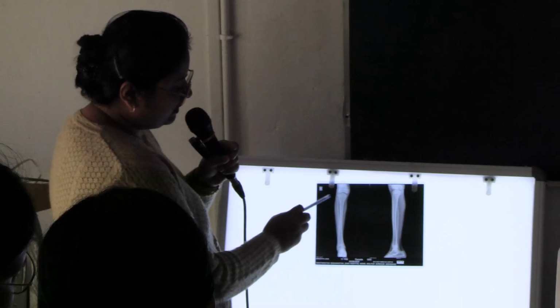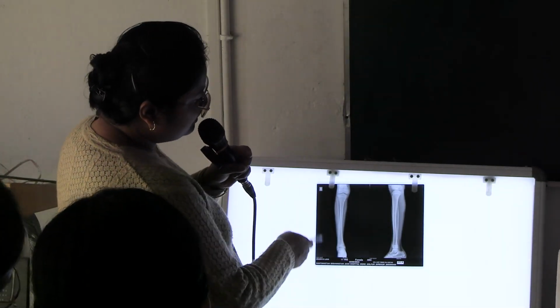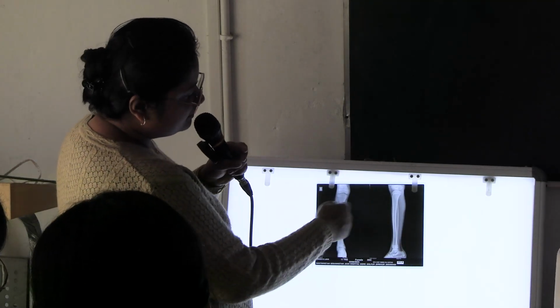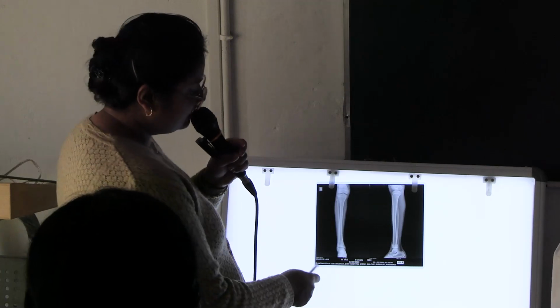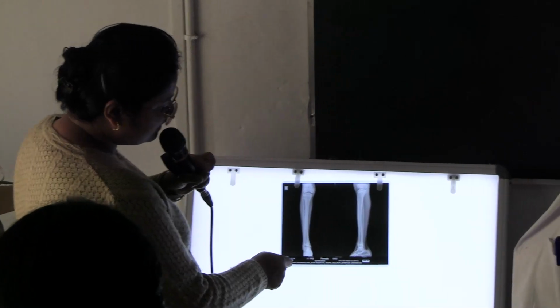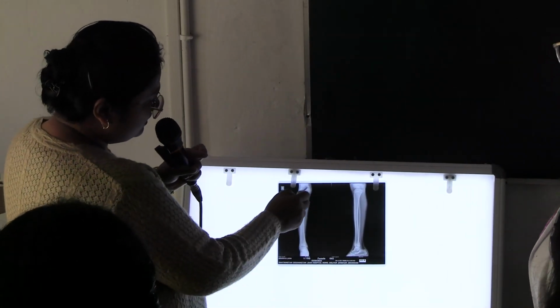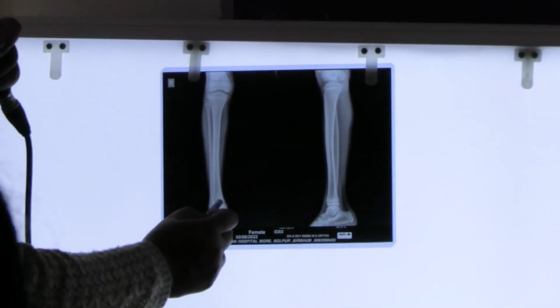Okay. Here also this is an X-ray of right side, right leg, also showing the lower end of the knee joint and the ankle joint also you can see here. This is tibia, fibula, lower end of femur. Here also this is X-ray of Aradhya Laha, 11 years female. So you can see the epiphyseal lines at the upper end, at the lower end also.